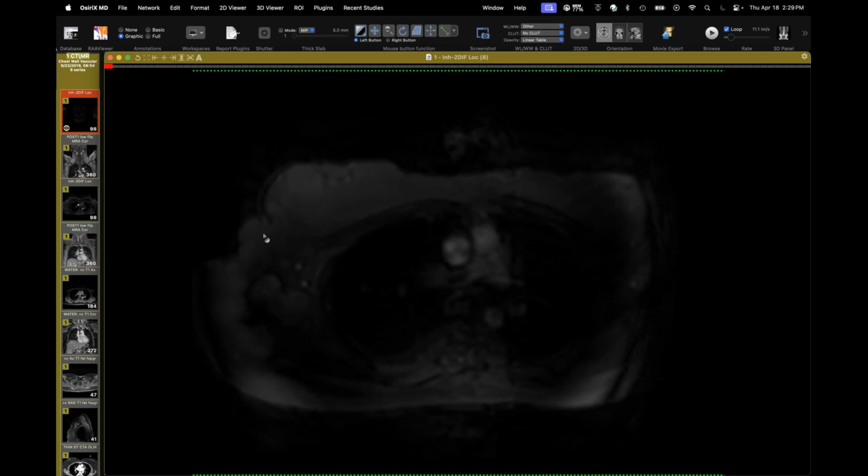They're very characteristic. They're just simple water density with really no perceptible wall, and they just kind of hang out. If they're a single one, if they can get to them, they can resect them, but you've got to always do source control.